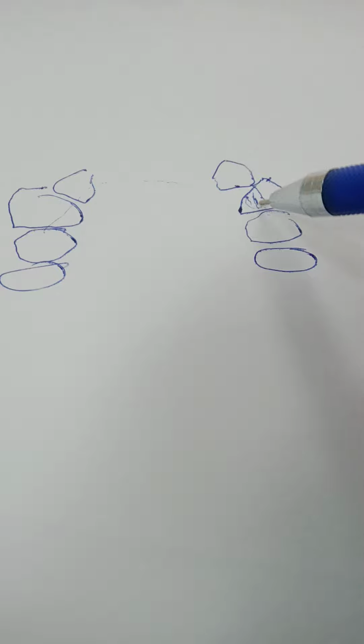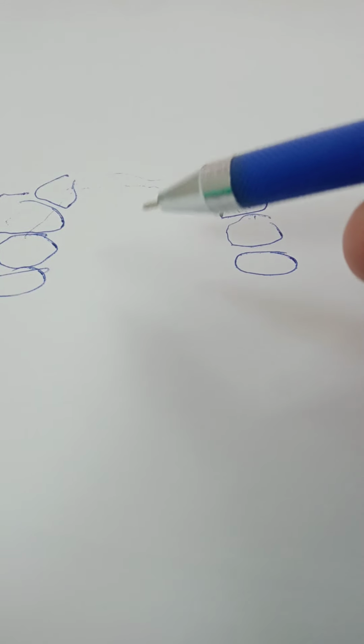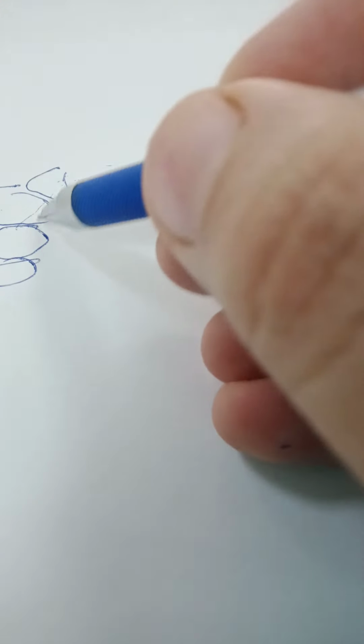The question that the doctor asked: can I only use the plate? We chose the plate as a major connector. Is the plate sufficient as an indirect retainer without the need to place rests? Now, the first rule for plates is that we don't want them to slip over teeth, because the morphology of the palatal or lingual surface of the anterior teeth is very sloped. We don't have a prominent cingulum to rest on, and we don't have the palate to stabilize them as well. There's no palate in the lower, so they will slip towards the gingiva a lot, and that will traumatize the gingiva. So any plate that is added should have rests.